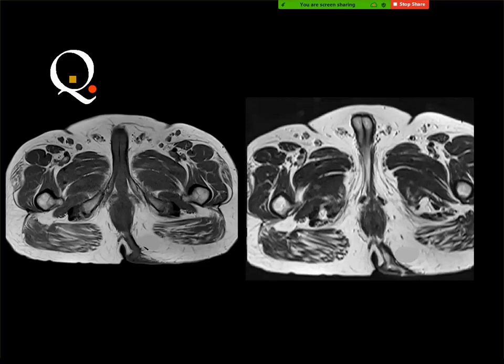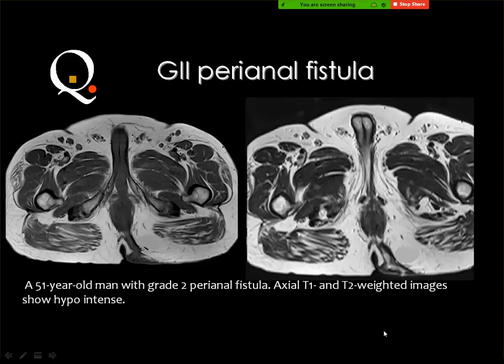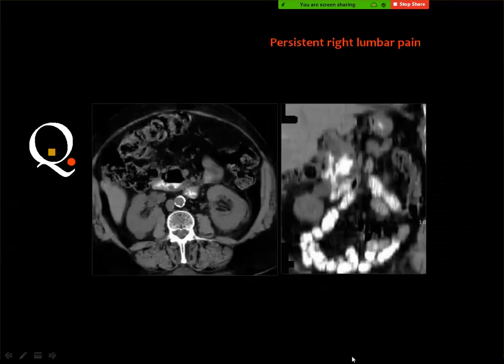Fistula. Yes, anal fistula, perianal fistula. Grade? Intersphincteric. Yes, grade 1? No, there is a side branch, then you consider it grade 2. If the fistula is only one track, this is grade 1. If there is a side track or abscess, this is grade 2.